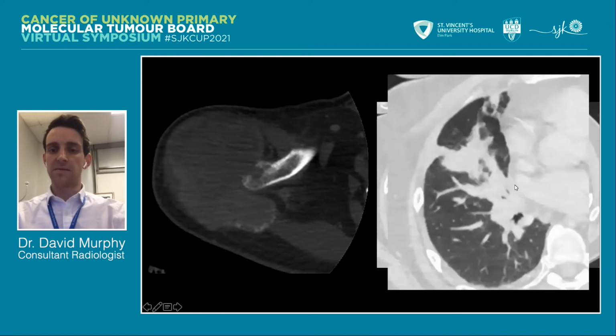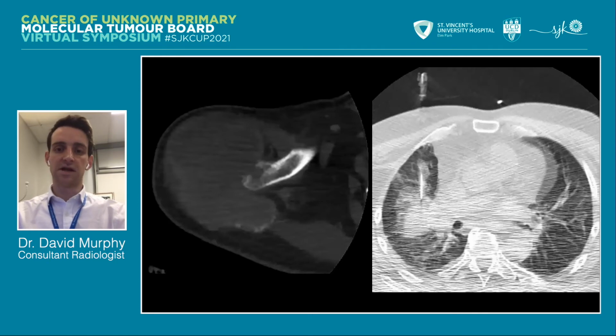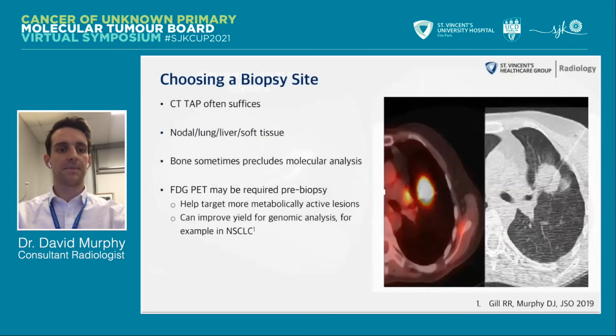When we looked closer, you could see an endobronchial cutoff sign in the right middle lobe segmental airways. With that and its persistence, we were suspicious that there was actually a mass-like lesion at this location with some downstream atelectasis. So we performed a CT-guided biopsy of this opacity, and this demonstrated a lung primary. So the diagnosis changed to a metastatic non-small cell lung cancer.